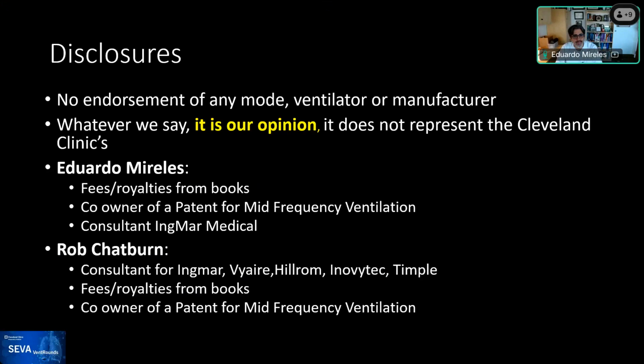All right, I'm seeing some answers come in. There's one for PMOS. Anybody else? Okay, so let's just talk a little bit about this. I see a good amount of answers saying there's a resistance there. Yeah, so there are some features that are suspicious for high resistance.